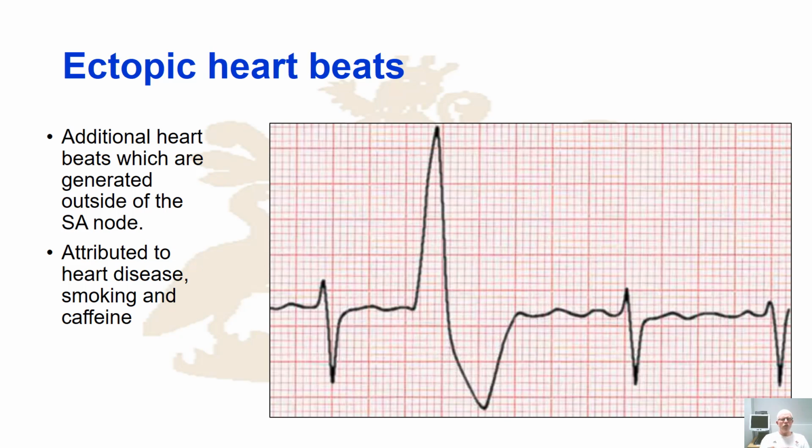So what can you see? Well, if you look very carefully, it's pretty striking. You've got an enormous sudden change in the electrical activity of the heart. Look at that sudden QRS deflection. Across the rest of them, if you look on the far left and across the right, you can see pretty normal activity of the heart.